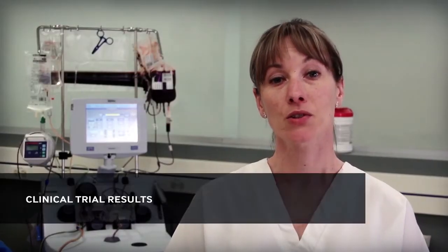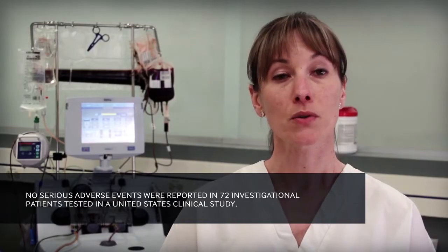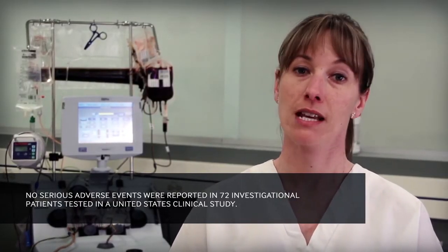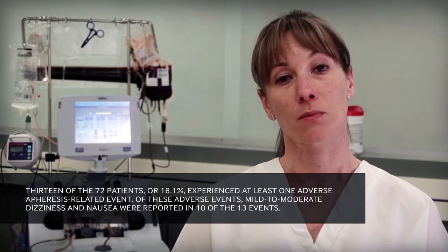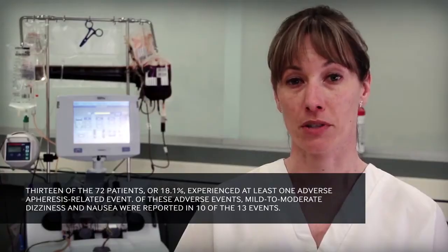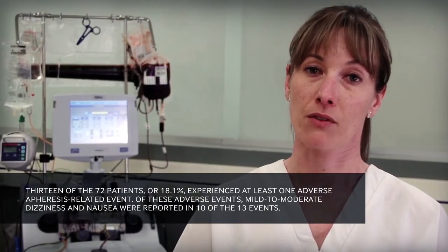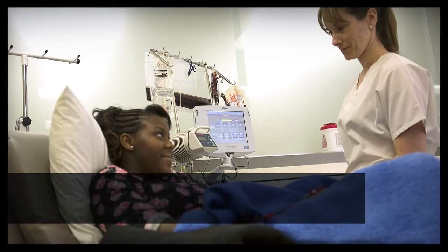A U.S. clinical trial was conducted on the red blood cell exchange procedure with the following results. No serious adverse events were reported in 72 investigational patients tested in the clinical study. 13 of the 72 patients, or 18.1%, experienced at least one apheresis-related adverse event. Of the adverse events, mild to moderate dizziness and nausea were reported in 10 of the 13 cases.